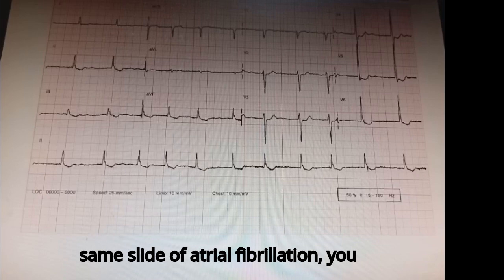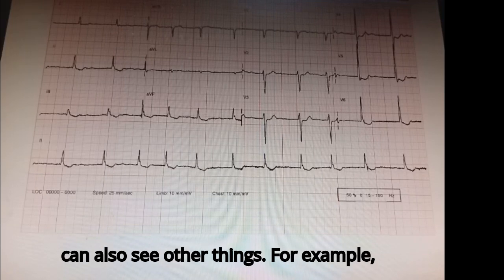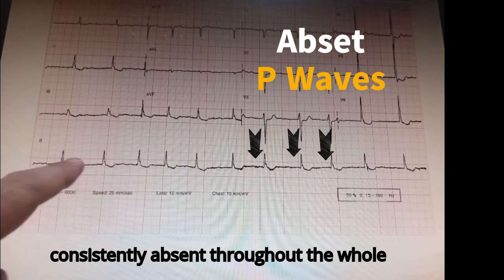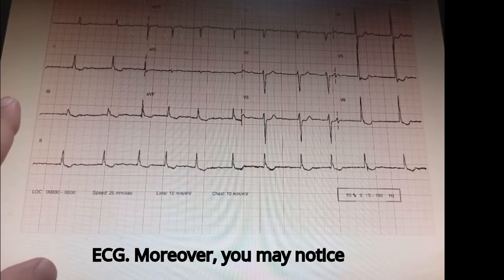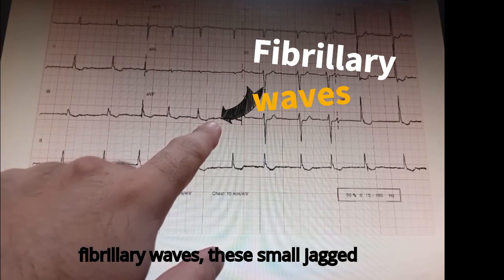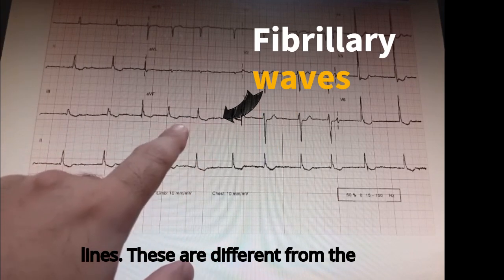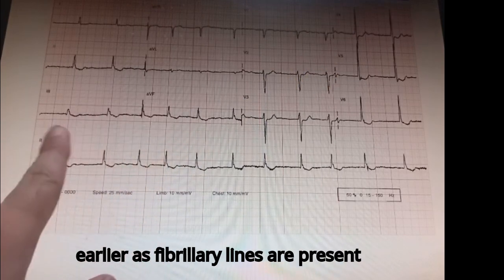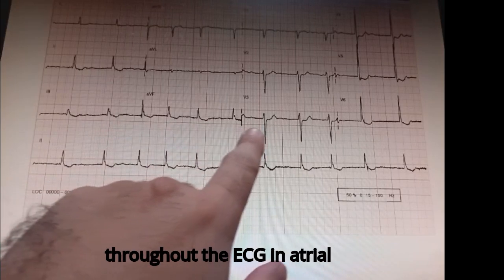In the same slide of atrial fibrillation, you can also see other things. For example, there is no P wave. P wave is consistently absent throughout the whole ECG. Moreover, you may notice fibrillary waves, these small jagged lines. These are different from the skeletal muscle contractions we discussed earlier, as fibrillary lines are present throughout the ECG in atrial fibrillation.